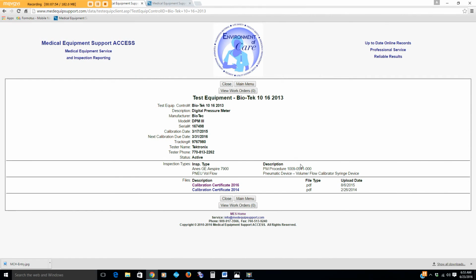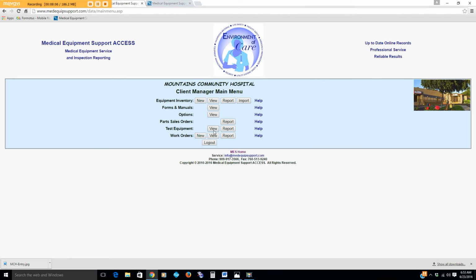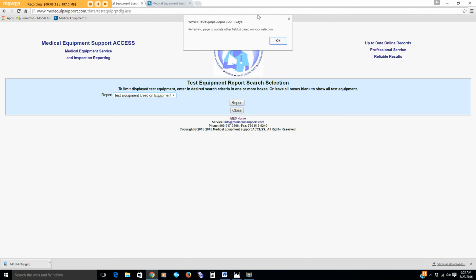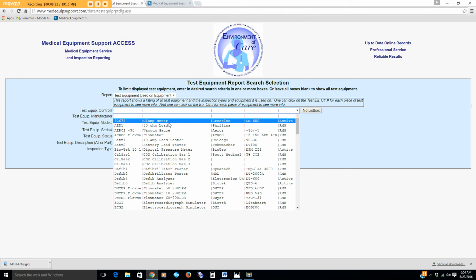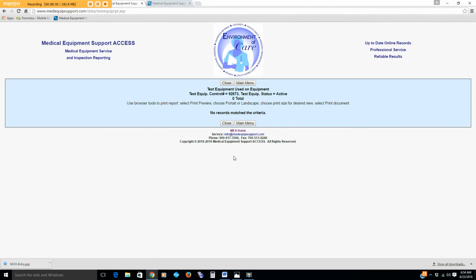And we'll close it out, and that's certainly available to give to whoever the accreditor is, the accreditation people inspecting you. We'll close it out. We'll go back to the main menu. You can also do a report. This report here is test equipment used on the equipment. In this case, say we wanted a specific device. If they wanted to, let's see, we're going to list the devices. Okay, we'll check this, and then when you fill out this information and you press report, it'll actually see if there's any matching records. In this case, there was nothing that test device was used on.